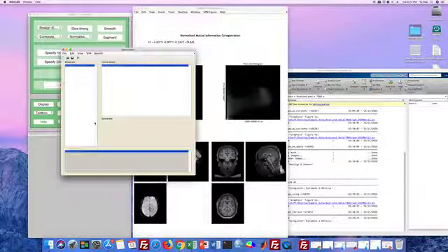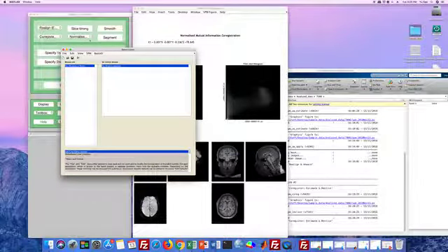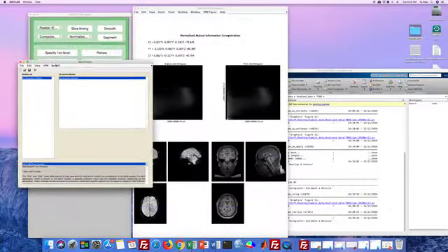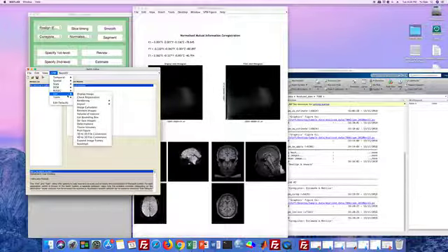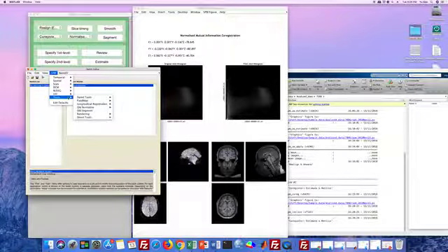Okay, how to do the spatial normalization? So click batch. Not here. Here is for the new spatial normalization approach, which is recommended for adults data. So here we need to click the batch, SPM, utility, and tools. Go to the old normalize, and then select the old normalize, estimate, and write.